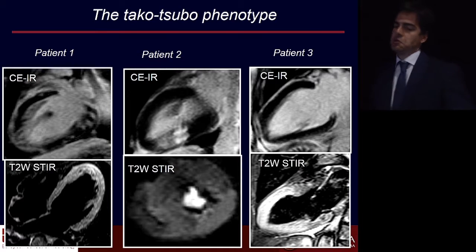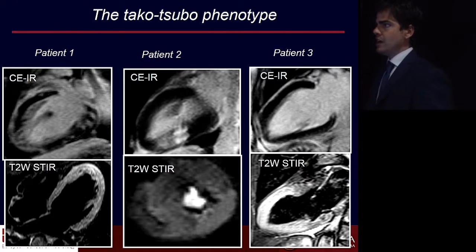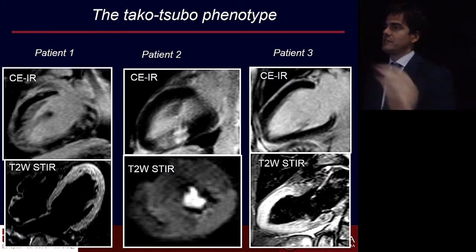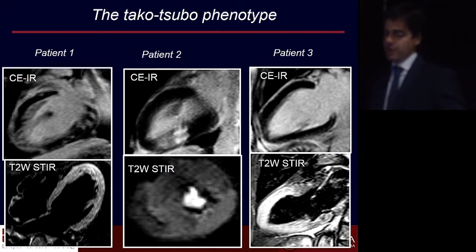Patient number 1, after a lot of questions, admitted that he was regularly using cocaine, and I went through the literature realizing that one of the effects of cocaine abuse induced myocarditis is a multifocal involvement with high edema related to the spasm of the vessel. So it's a typical case of cocaine-induced myocarditis. In patient number 2, there was a spontaneous acute myocardial infarction. What's interesting, you should not think about infarction as an entity associated only with a severe stenosis. There might even be a transmural process without evidence of stenosis because coronary spasms or microcirculation may cause that.